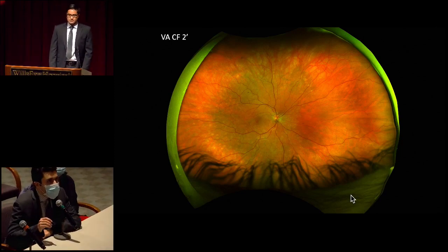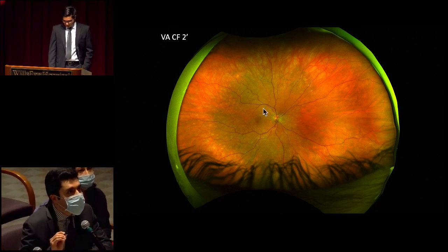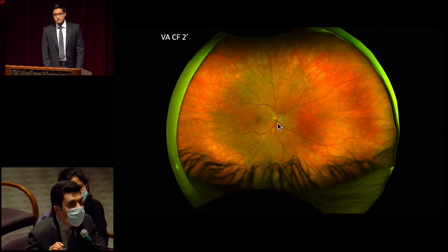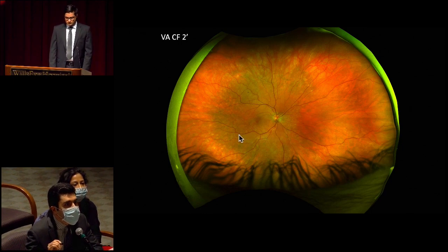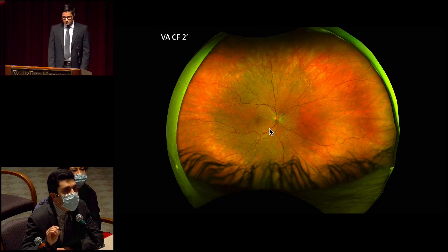So we have a pseudocolor wide field fundus photo of the right eye, decreased central acuity to counting fingers. The media itself appears clear. The disc on the inferior aspect looks a little full here. Maybe the vessel is going through an elevated area down here. I don't see any cotton wool spots or disc hemorrhage though. In regards to the vasculature course, they seem to have a tortuous appearance to both the veins and the arteries.